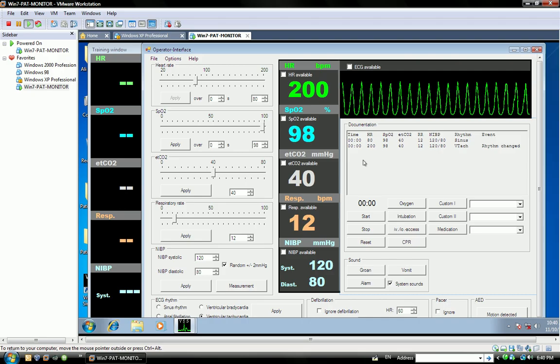If that appears, then the waveform will be like this, up and down, zigzag, instead of the monotony flat, low. Then it will be most important. The doctors will check the NIBP when the patient goes to the hospital in this fictional scenario.